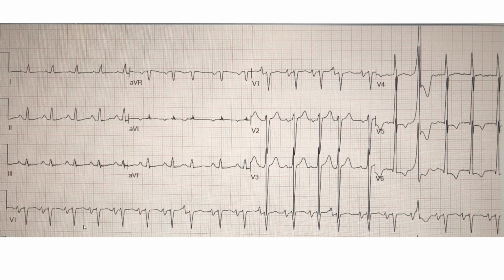I see something else. He's in sinus tachycardia. So I can already, by looking at that EKG, make the diagnosis. This is a patient with low EF, likely non-ischemic cardiomyopathy, who's presenting with decompensated heart failure, maybe pre-shock, maybe full-blown shock, just by looking at the EKG. That's how valuable EKG can be.